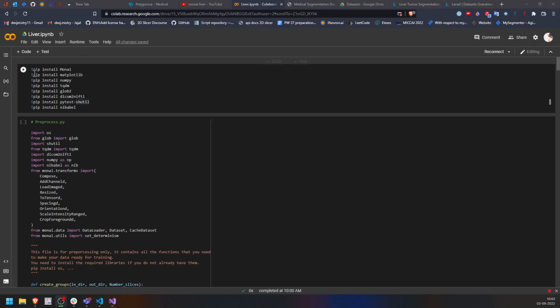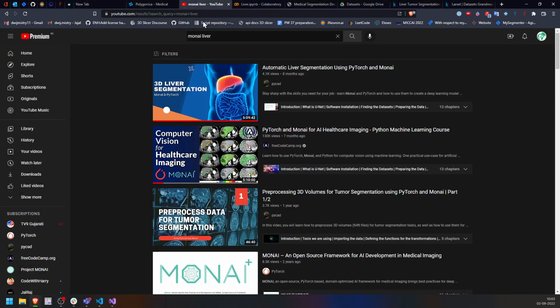In this video, I'll show you how I performed the liver segmentation using AI. For this, I just Googled "Monai liver", and here you can find these videos. In these two, Bikeaid and freecodecamp.org, both are the same videos. You can follow any one of these.